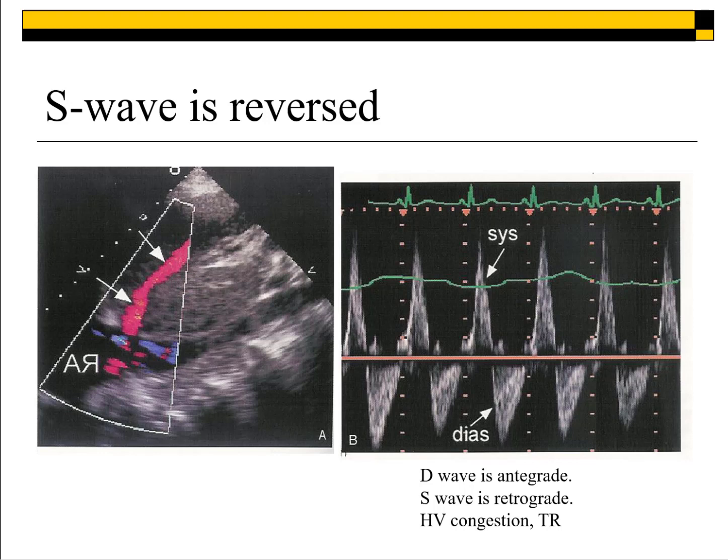So that blood flow is just able to still passively drop into the ventricle there and fill up the atrium. So that's the only time we're going to see it, the D wave below, and then we're going to have the ASV complex above the baseline. So biphasic waveform: if you see a biphasic waveform in a hepatic vein, you automatically think tricuspid valve regurgitation. Blood flow is leaking in the tricuspid valve going the wrong direction.